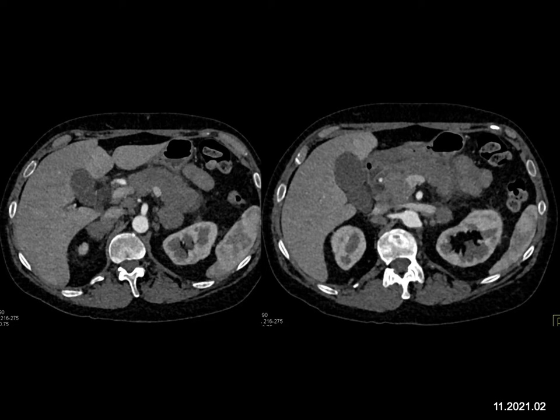Well, TB can involve the adrenals, but not the pancreas. And lung cancer, you can get Mets to the adrenal, that's possible, and you get Mets to the pancreas, but not diffuse infiltration. And as I mentioned, this does not have the look of pancreatic cancer. It's too infiltrating. If this was pancreas, I would say it's lymphoma. And in fact, that's the answer.